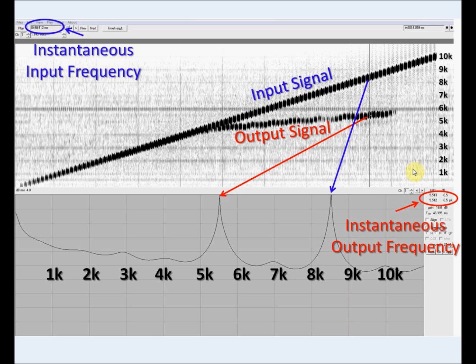Along the y-axis of the spectrogram we have frequency. Each line represents 1,000 Hz: 1,000, 2,000, 3,000, and so on. I added these tick labels to the display, so you will not actually see them during the live program.